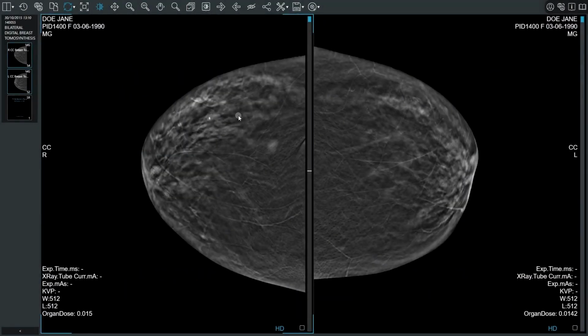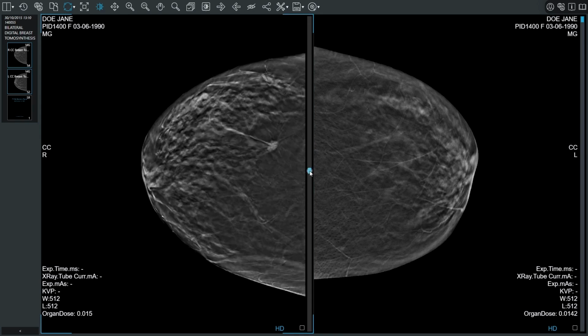If the structured report includes graphical annotations, these can be overlaid on the reference images. White ticks on the scroll bar on the right side of the panel indicate the locations of graphical annotations within the image series. Click a tick to jump directly to the corresponding image.